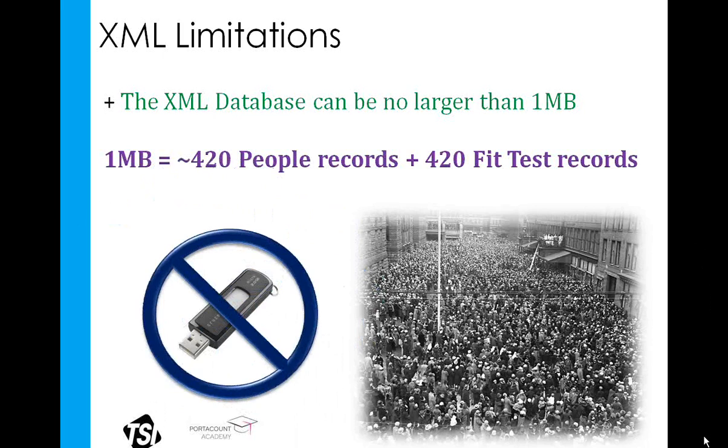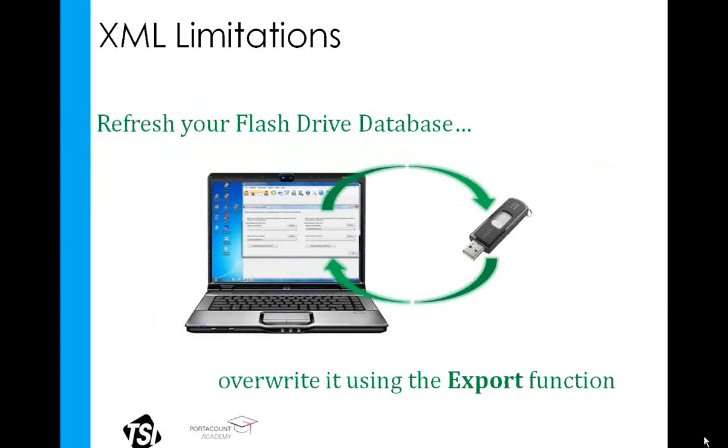So if you happen to have thousands of people lined up outside your door to get fit tested, you will want to use a computer with the FitPro software rather than the standalone mode function. Now, if you do happen to have more than, say, 1,000 employees, and you still want to make use of the standalone flash drive database feature, that's fine. You're just going to need to periodically reset or refresh your flash drive XML database.